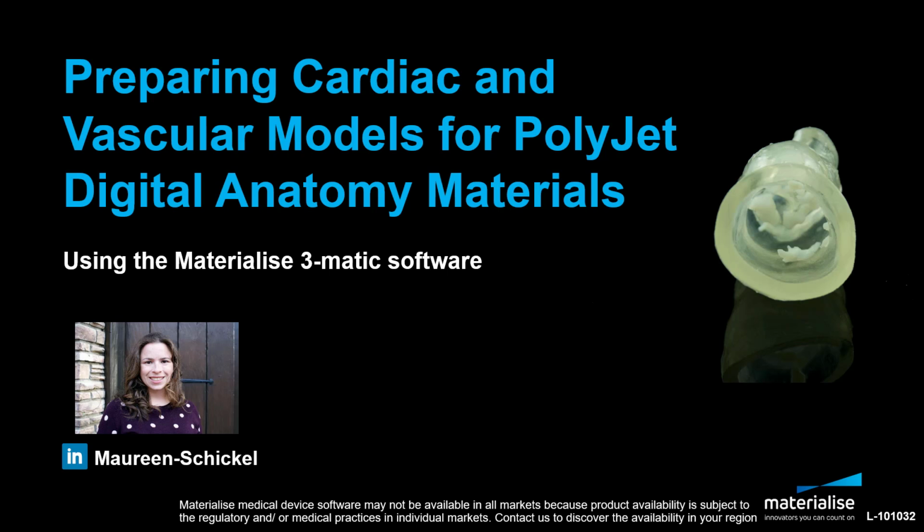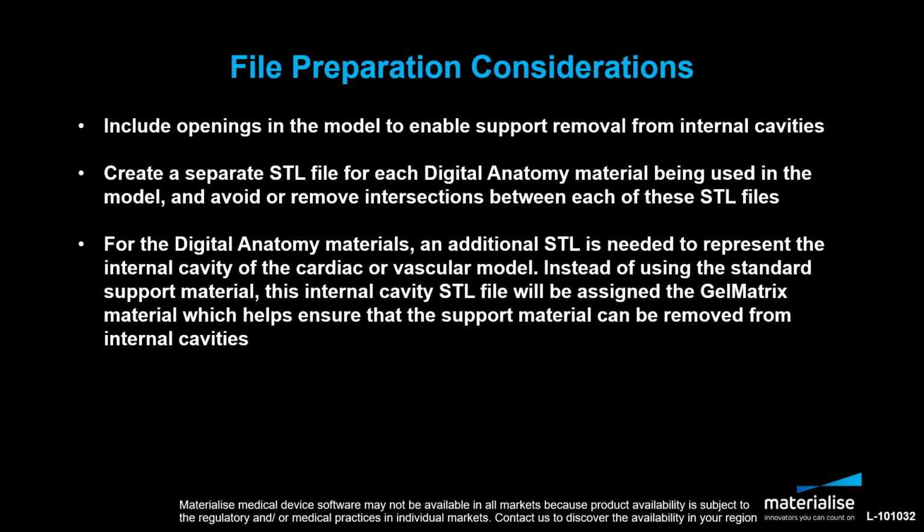In this tutorial, we will talk about how you can prepare cardiac and vascular models for 3D printing with the PolyJet Digital Anatomy materials using Materialise 3matic. To start, let's go over a few file preparation considerations for cardiac and vascular models.